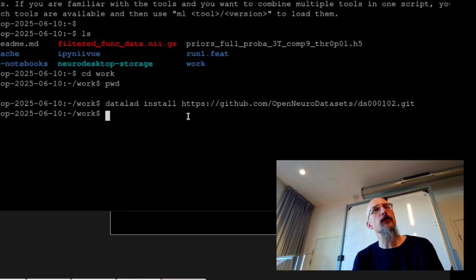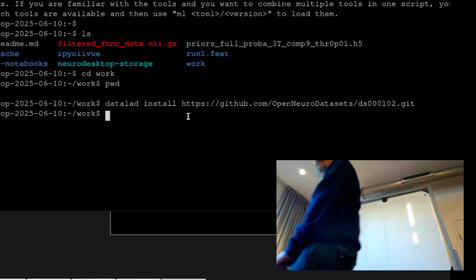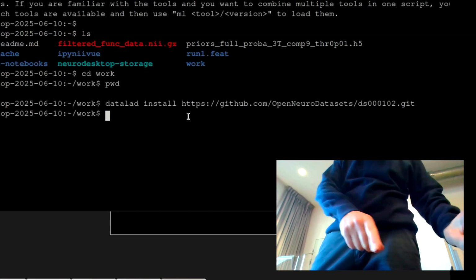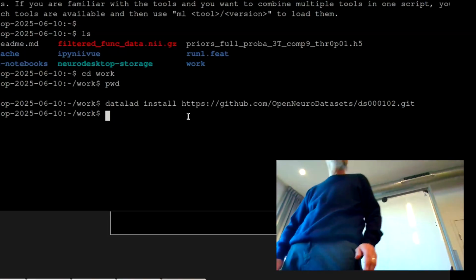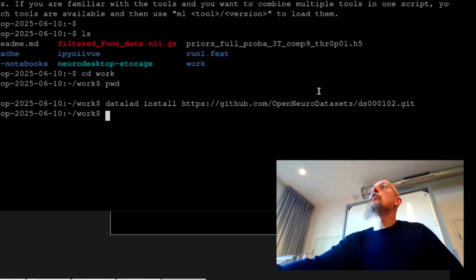Okay. So for some of you, the one on the cloud version, there is a trick. But the problem is I know the trick on Windows, but on Mac, normally you do Control Alt Tab, and it will open a menu where you can copy and paste stuff.